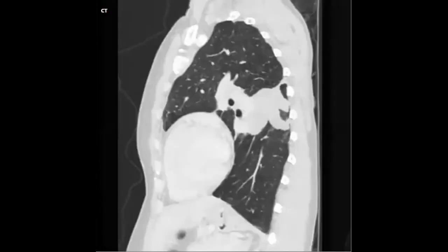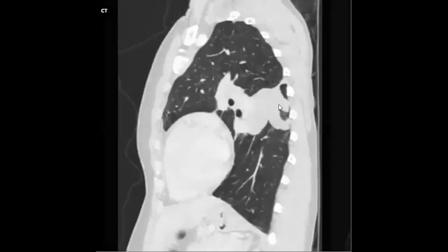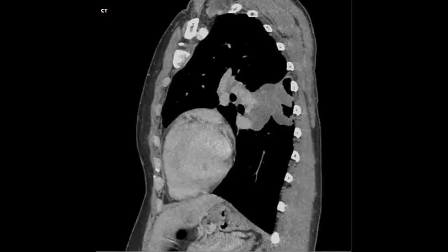Sure, it will be difficult on the X-ray, but if you go to the CT, you can get it more easily with this appearance. And yes, it again makes obliteration of the left hilum. So what do you think about this appearance? Yeah, I agree with you, it makes what is called bronchocele. So 1, 2, 3 at least. There is obstruction here. So this is what is called finger in glove appearance, branching lesion.